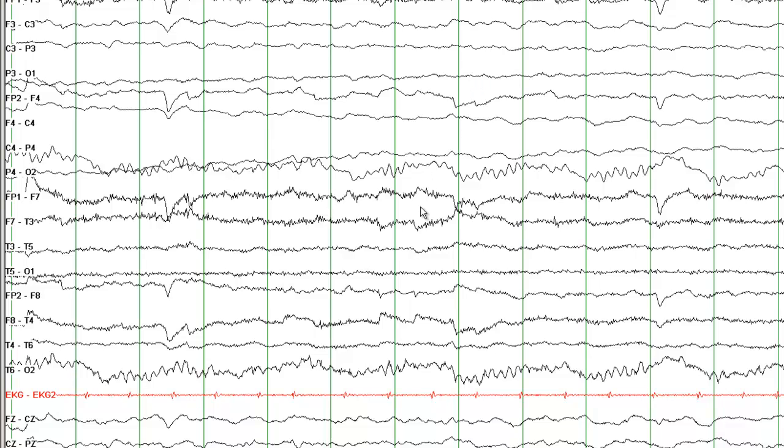So you can say that this EEG demonstrates an asymmetry between the left and the right hemisphere. Between these two green lines, you see more or less delta and theta frequencies. So comparing the left parasagittal with right parasagittal, you see slowing on both sides, but there is an asymmetry in the alpha frequency that's seen on the right occipital and not on the left occipital region.